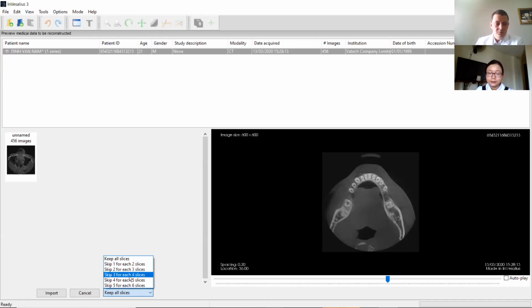So me, I want to go fast for the presentation, so we skip 3 for each 4 slices, meaning we take one slice in 4.